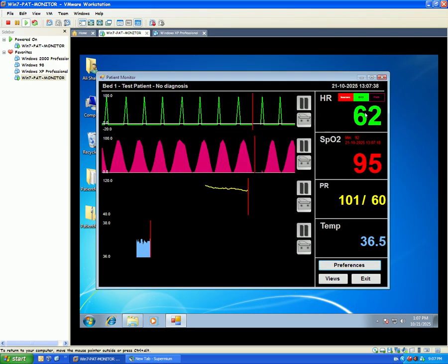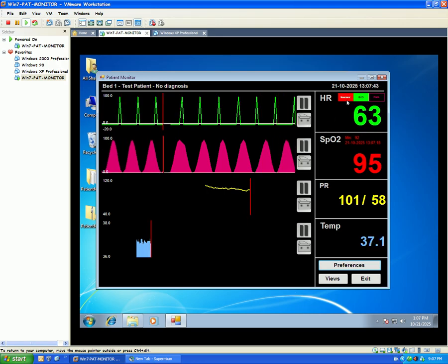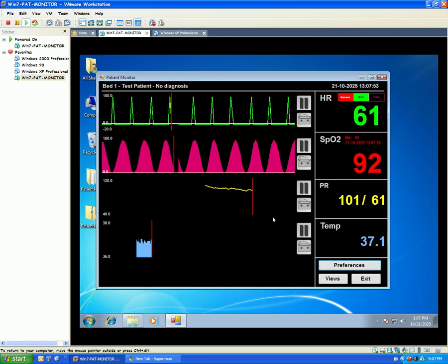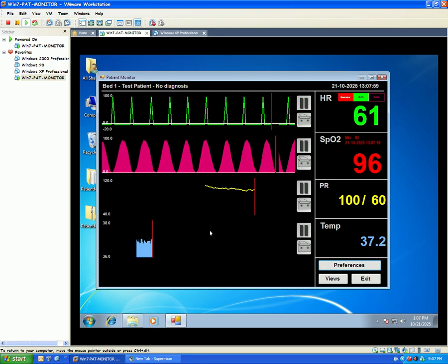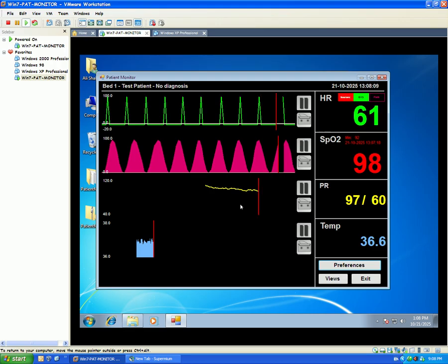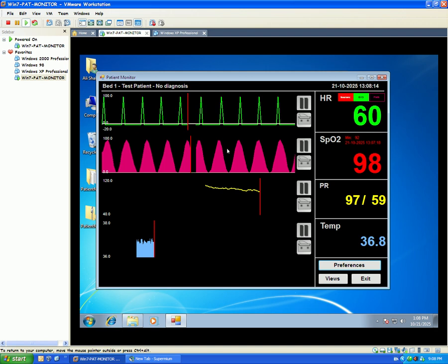Now, the heart rate is 60 to 62 beats per minute, and the source, which is highlighted in the red box, is EKG and pleth. And the SpO2, pulse rate, and temperature are all part of the user interface, even the wavelines, which are right here. Even the buttons and the structure, all of them are the user interface. Now we're done with the user interface. Now we're moving on to the interactions.